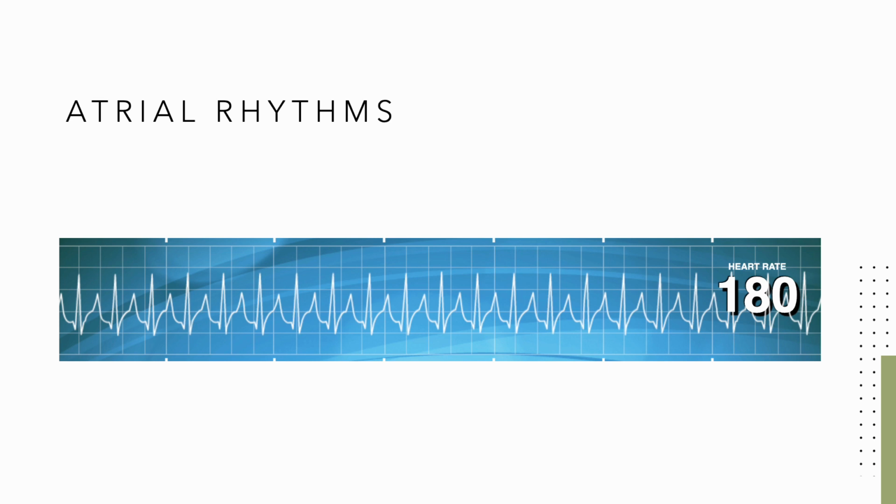Supraventricular tachycardia, or SVT, is an umbrella term for any tachycardia that is happening in the atria, i.e., supra to the ventricles. I will discuss some of the specifics about SVT, like AVRT and AVNRT, in the next lecture. SVT is defined by a narrow complex regular tachycardia with a rate greater than 150 beats per minute. SVTs are usually caused by a reentrant cycle, like a merry-go-round, continually activating the ventricles.